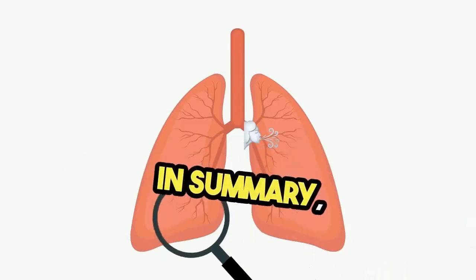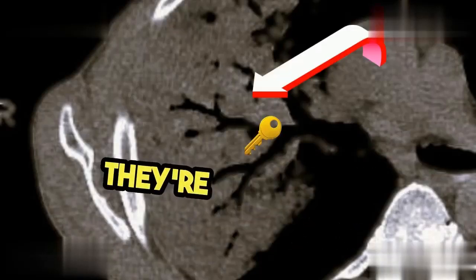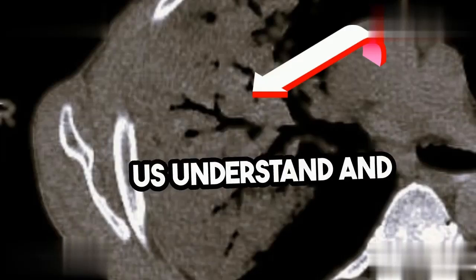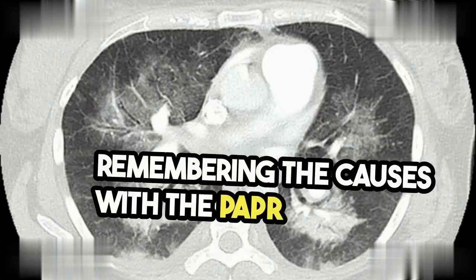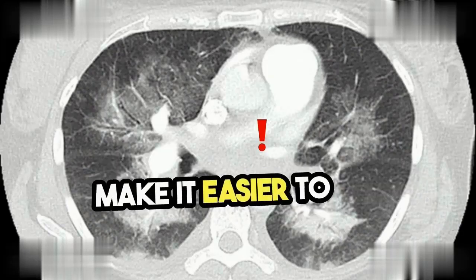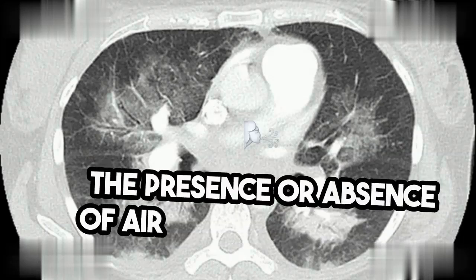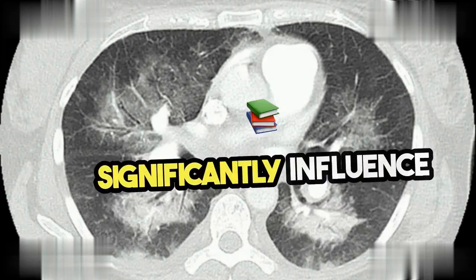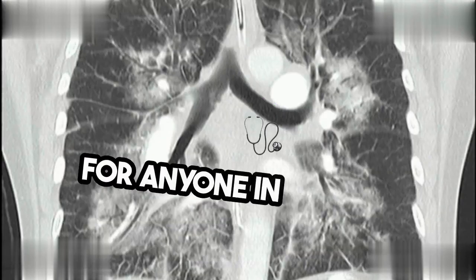In summary, air bronchograms are not just a radiological curiosity. They're a key sign that can help us understand and diagnose various lung conditions. Remembering the causes with the PAPR mnemonic can make it easier to recall these important concepts. The presence or absence of air bronchograms can significantly influence clinical decisions, making it essential knowledge for anyone in the medical field.